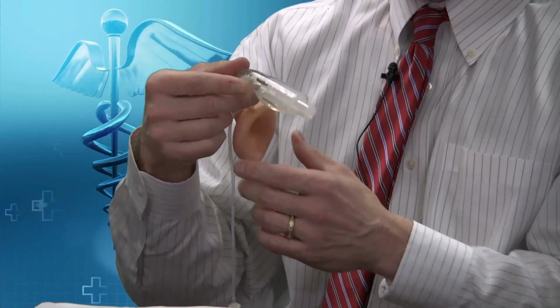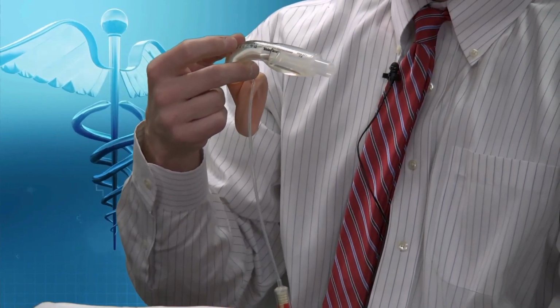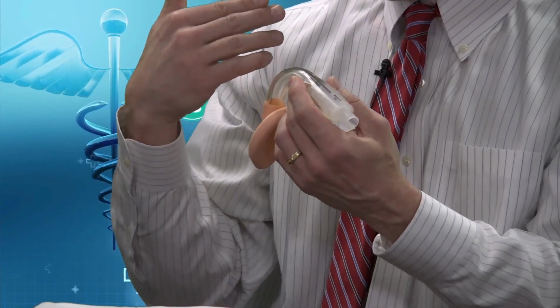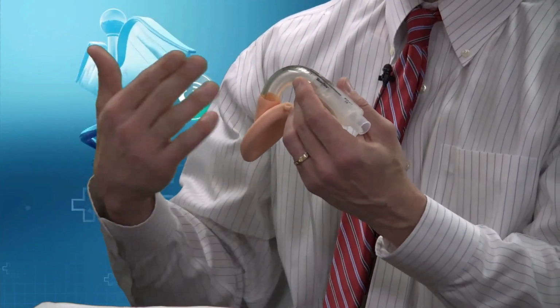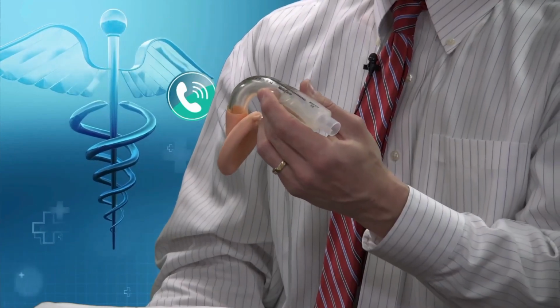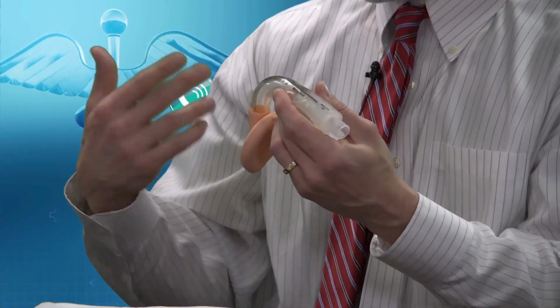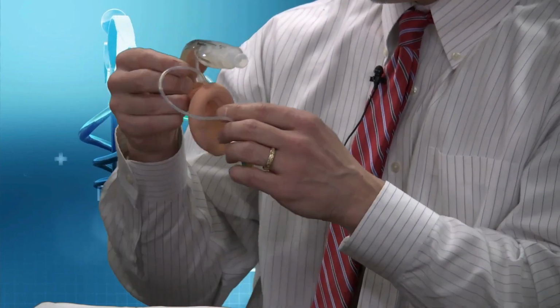And this is less invasive, usually gives patients less discomfort after waking up. And essentially, I would say almost all of Dr. Perlmutter's cases that we end up having to do under general anesthesia, we utilize the LMA because it's a less invasive modality. And so the tube doesn't go in the actual windpipe? No, it just sits above the windpipe.